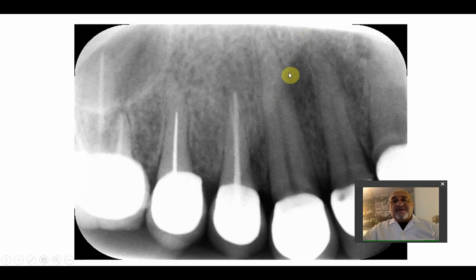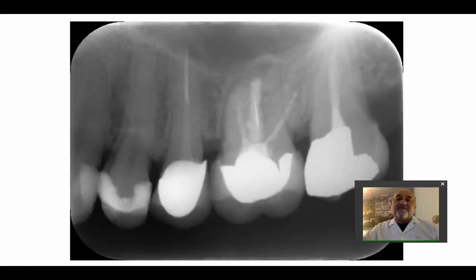You see this line over here? There is a difference in contrast between this area and the one over here. This one appears more radio-opaque. Actually, this is the cast of the naso-labial fold. The naso-labial fold will cast its shadow on this area, and thus it will appear more radio-opaque. If you go back to the previous slide, you will find it here, this one.